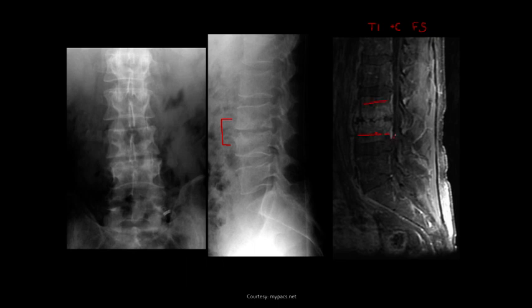We have a little bit of paraspinal or epidural abscess as well, where it's kind of spreading in the posterior tissues, kind of going beyond the vertebral bodies. And then clearly that disc plane right there is not normal compared to the others because there's that destructive change.